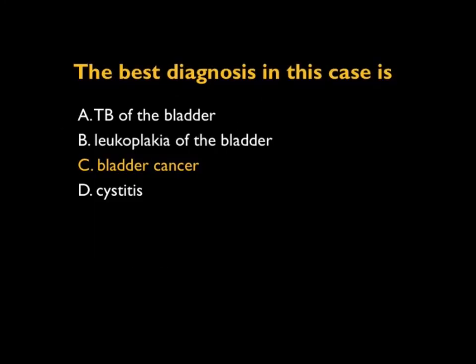The classic diagnosis of a bladder mass with calcification is going to be bladder cancer, and indeed that is the answer in this case.